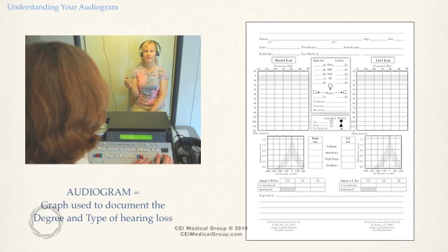As you can see from this form, here at CEI, there are other tests your audiologist may complete for a well-rounded approach to your hearing health care. However, for now, we'll just focus on the audiogram. Let's look closer.